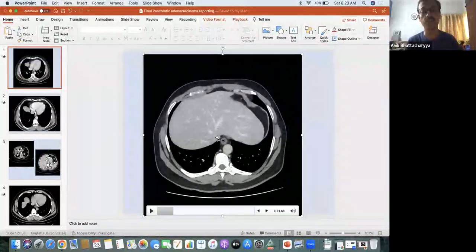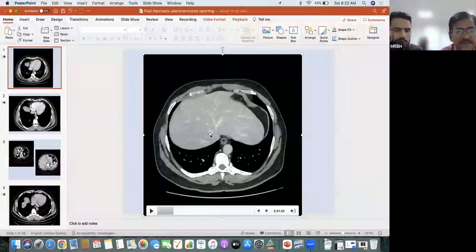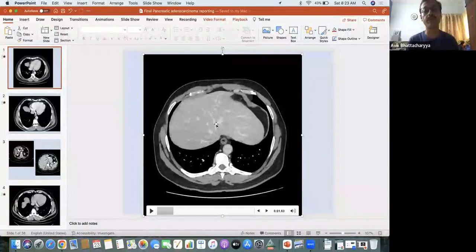It is draining into the suprahepatic inferior vena cava. My cursor is seen, no, sir? Yes. We can see. Okay. And these hepatic veins and their branches are seen in the cranial sections of the liver.